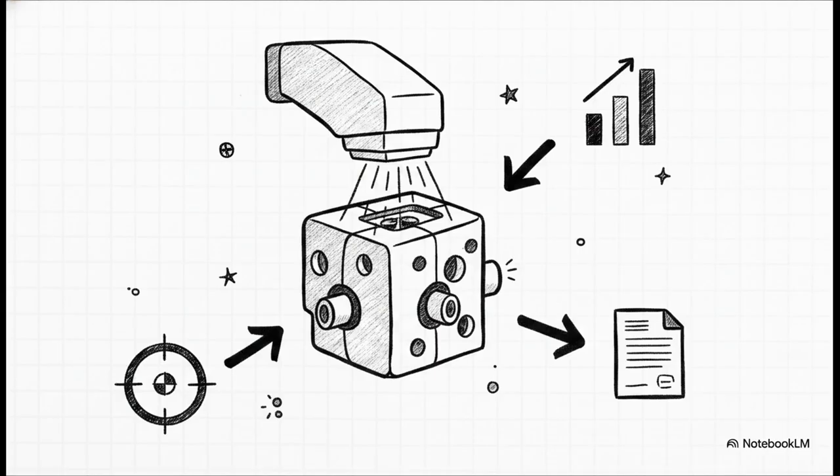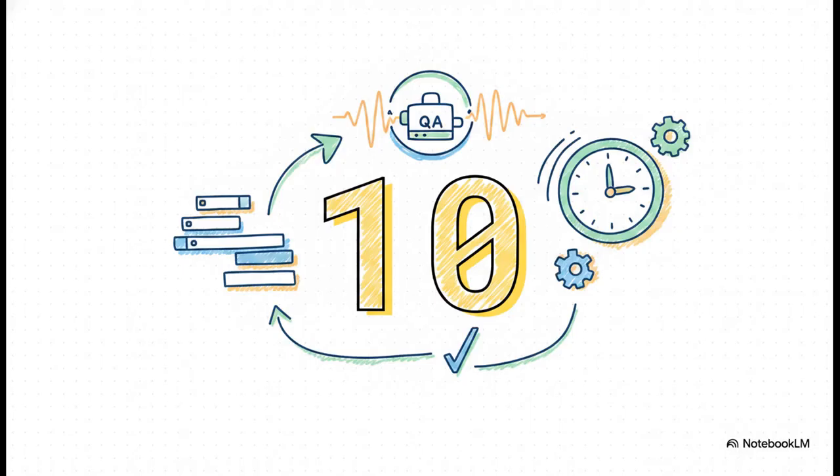It even has automatic phantom registration. So yeah, your phantom setup on the couch doesn't even have to be perfectly aligned for it to work. How cool is that? And to really put its efficiency into perspective, just think of the number 10. Most of these incredibly complex QA scripts can actually be executed with less than 10 lines of code. It is an absolute game changer for saving time.